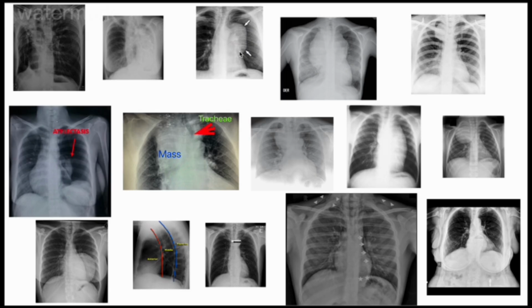So here we can describe it as enlargement of the mediastinum, lobular enlargement predominantly on the left. It affects a bit of the upper and the middle mediastinum, and then we describe it like that. On the other hand, we can get bilateral lobular enlargement of the mediastinum, and of course we can also say that it has a negative silhouette sign, and probably it is in the posterior.